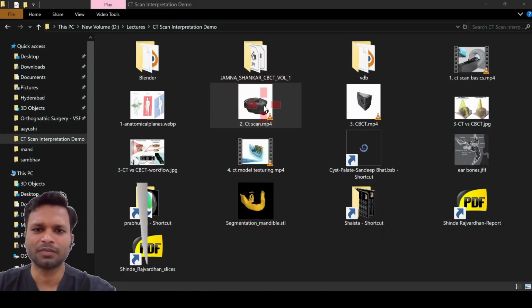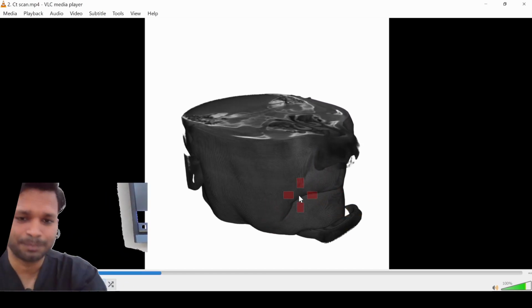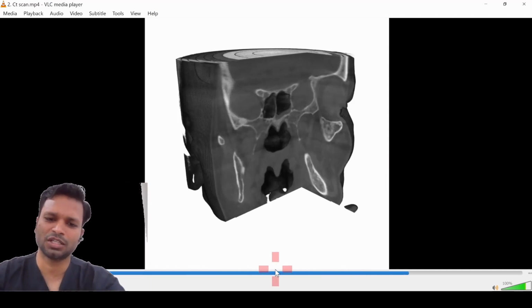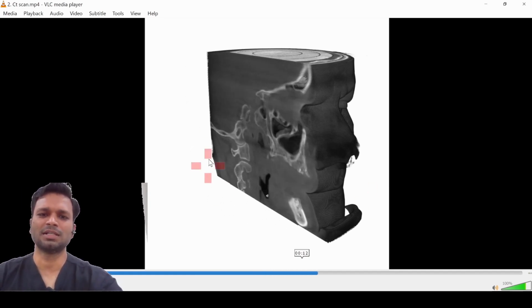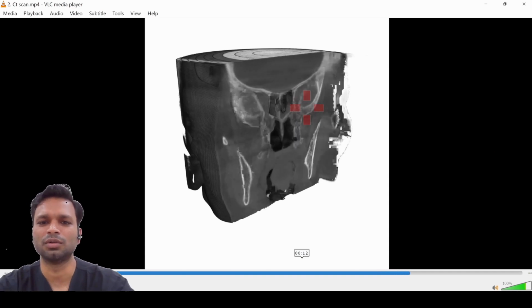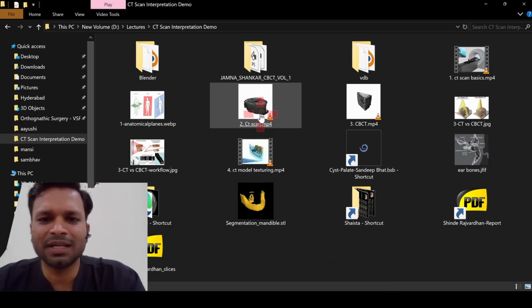Okay, so I'll show you an animation again. So basically इसमें क्या हुआ, you can see the axial slices that are being stacked on top of each other like this. Okay, and you can even see the lines of the slices. Okay, so once we have the 3D view, we can cut this 3D view into any other view, the view that we want to generate. So initially this was, let me go back. Okay, so this is the sagittal view that is generated from the axial view. Okay, then we have the coronal view. Okay, now if we want कोई अलग ही view बनाना है, we can do that also, which is a combination of sagittal and coronal in this case. We can also generate an OPG view also if we want. Okay, I'll show you the technique. Okay, so this was basic CT scan.